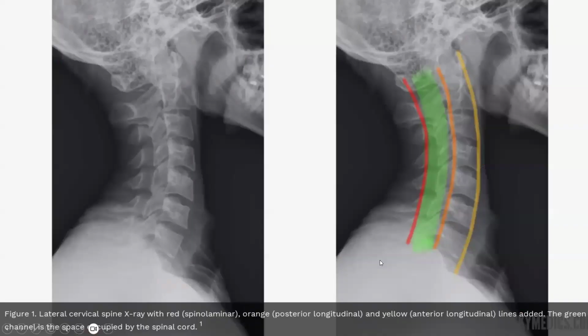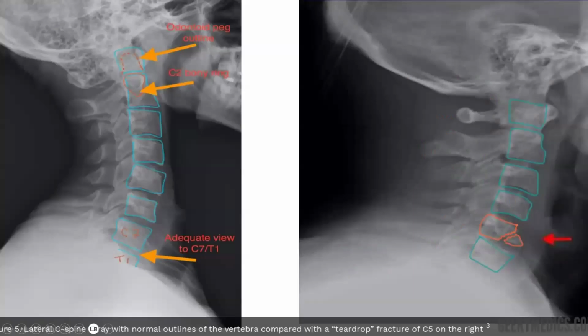Okay, so is this adequate or inadequate? Adequate, sir. Okay. What about alignment? Yes, alignment is also there, sir. Okay. And regarding accuracy?